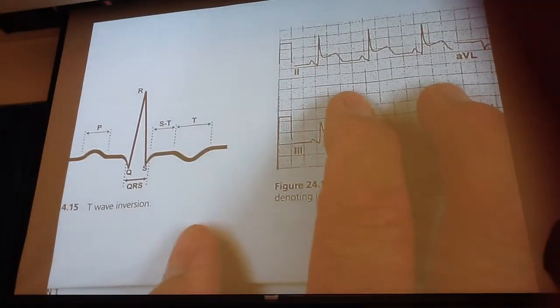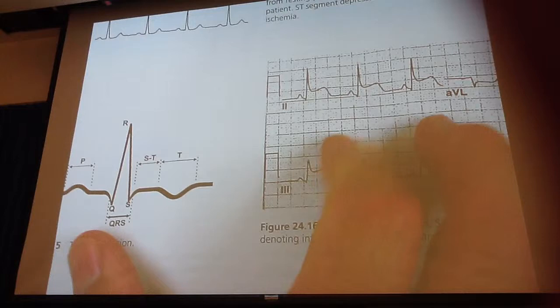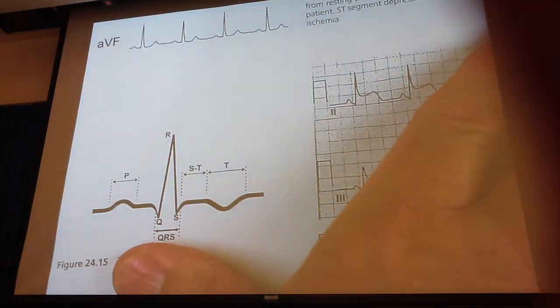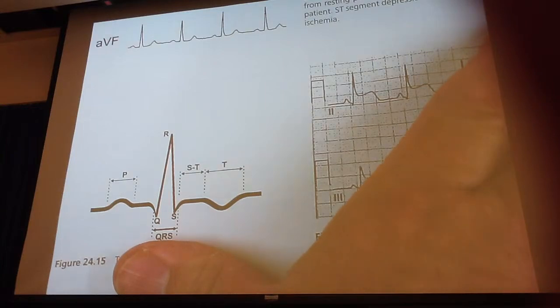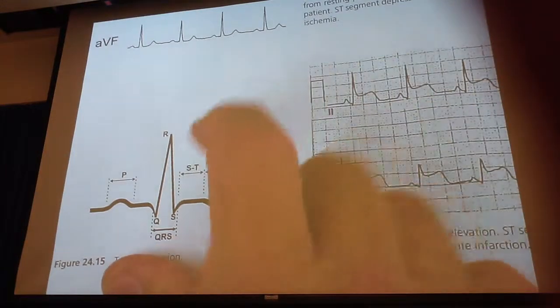And then another one we have over here. What's going on with this one here, guys? I'm going to cover this up here because I don't want you to. You need to get used to looking at the patterns. Which one? This one here.